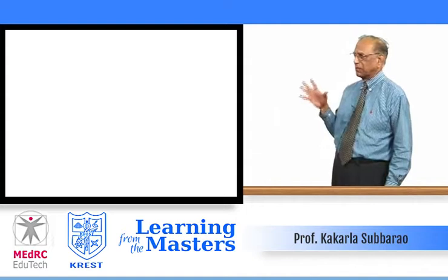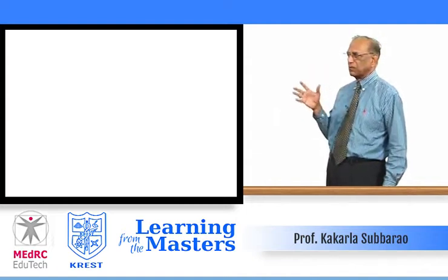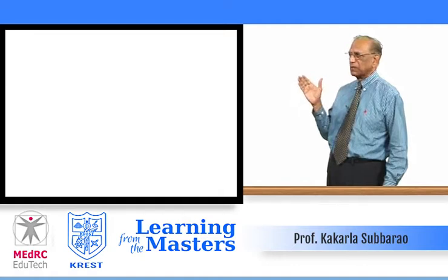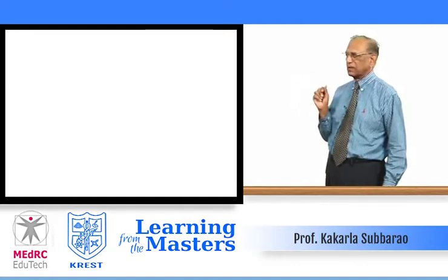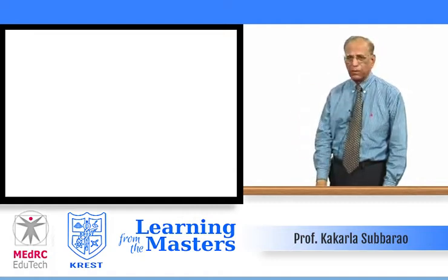Another pleural effusion, but again notice, if there is a total pleural effusion, the heart must have been shifted to the contralateral side. Few scattered fibrotic infiltrates are there. In the lateral view, it is all located posteriorly. This is a loculated pleural effusion. Chronic empyema, in other words.